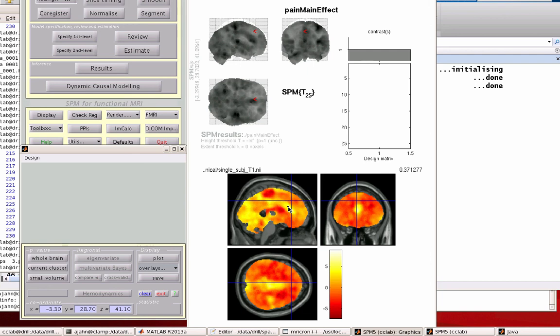Now, this is a special case where I can't use a simple interaction test because some of these regressors tend to overlap a little bit and it's not fully teased apart like that. So this was a case where k-means would be useful, and instead of doing a bunch of different interaction tests, just doing a single k-means to simplify it and make it much more readable for publication. All right, this is going to be a two-part tutorial, and we're near the end of the first part, just giving you a background and showing you how to set it up for the actual k-means analysis.